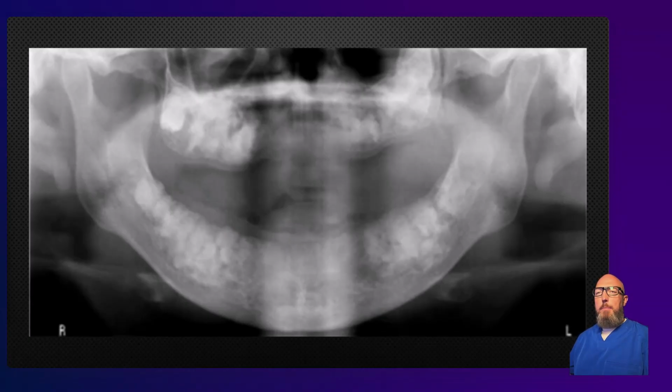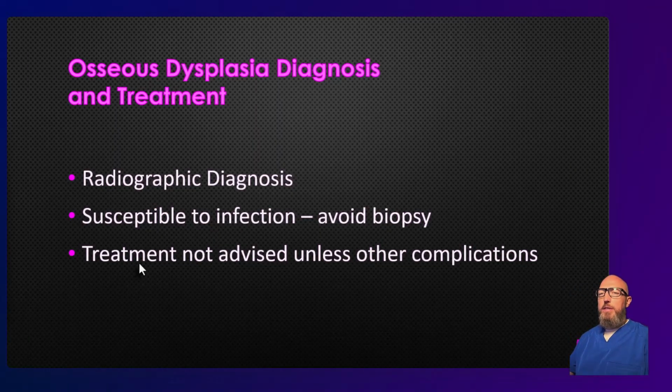And there's one other type I didn't quite mention in this presentation, but when it's in a single region outside of the anterior mandible, typically that occurs in the posterior mandible, then we call it focal Cemento-osseous dysplasia. So periapical, the most common, the anterior mandible. Focal for when it's one area outside of the anterior mandible, and then florid when it's multiple areas and can be widespread.